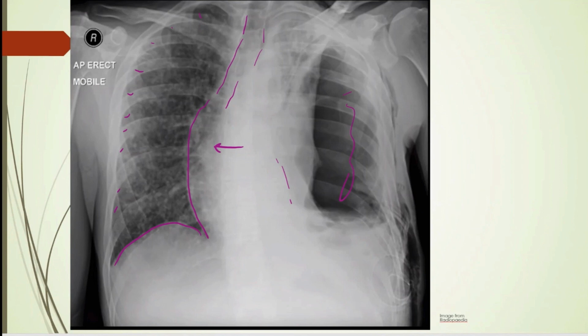Again, you need to take the clinical picture. I realize before that you really need to have a clinical picture of a tension pneumothorax as well. So in any case, we're just looking at x-rays alone, but I would call this a tension pneumo. So you look at, and this is the pleura right along here. And here is fluid or blood. You see this nice level that there is here. It kind of goes across straight. And that tells you it's a fluid. And you look over here and you see a lot of subcutaneous air here.